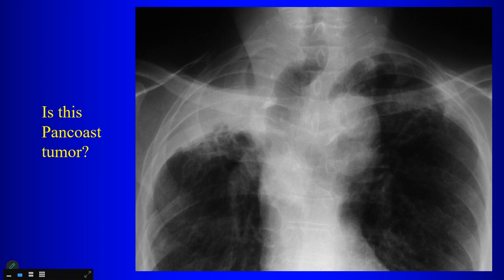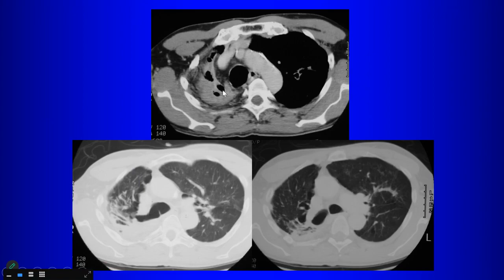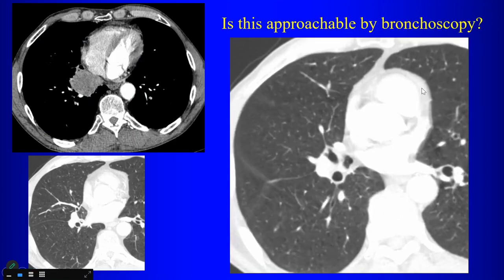For right upper lobe cancer, it is conceivable you might have some spillover on the left side. But around here in this hospital, TB, right, this is tuberculosis. This is scarring from tuberculosis in this particular patient, okay? So all of these changes here in the right apex, and there are also some changes on the left side. This was a patient with tuberculosis.